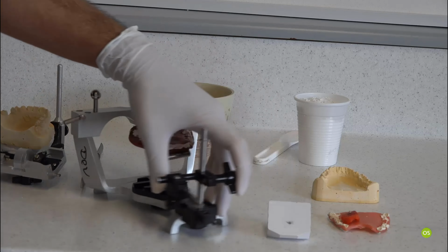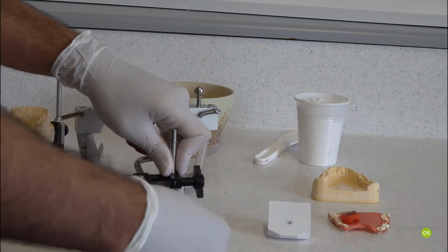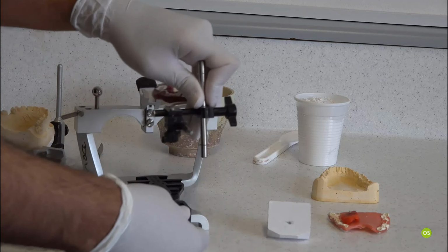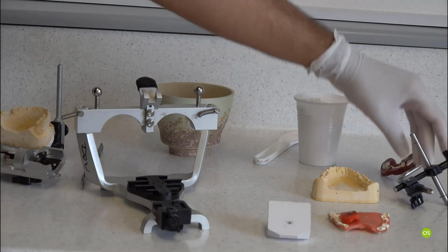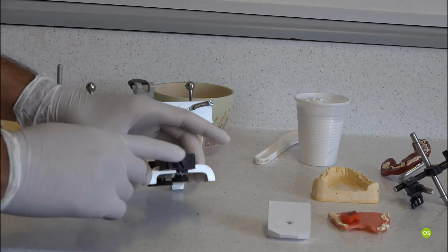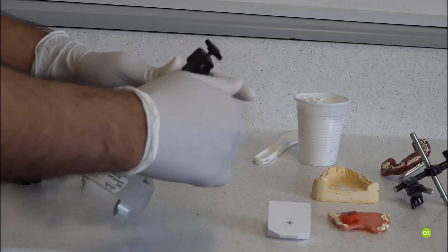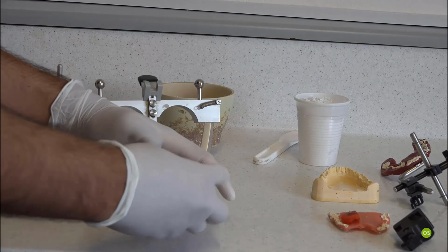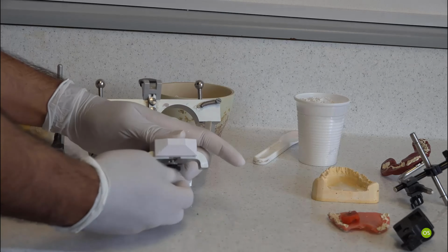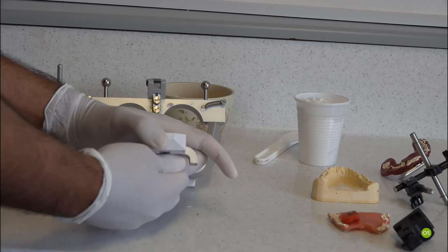I will now take the facebow record out because we don't need it anymore. We don't really need this mounting table either, because that was there to hold the facebow record. So I'll take that out and I'll use a normal table again, because this is much easier to deal with when you are assessing and evaluating models.